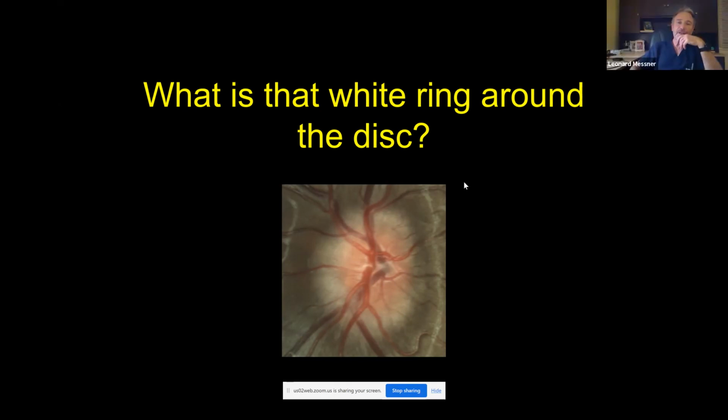Yeah, that's a great point. And I love that analogy of fossilized aggregates within the optic nerve. Remember, I showed you a case earlier where the cup fills in with chronic atrophic papilledema, filling in with axoplasmic garbage that essentially eliminates the appearance of the central cup. That's simply another way of saying they develop drusen over time, but in that instance, due to chronic papilledema. We're all caught up there, my friend. You've got the floor. Okay, great.